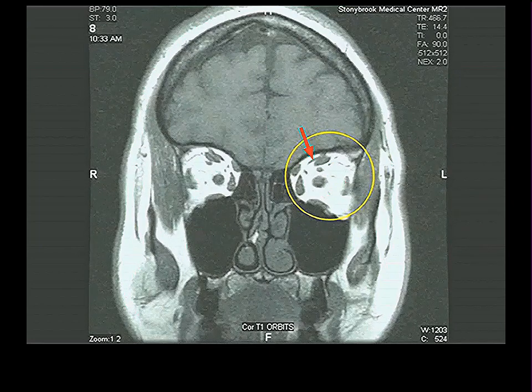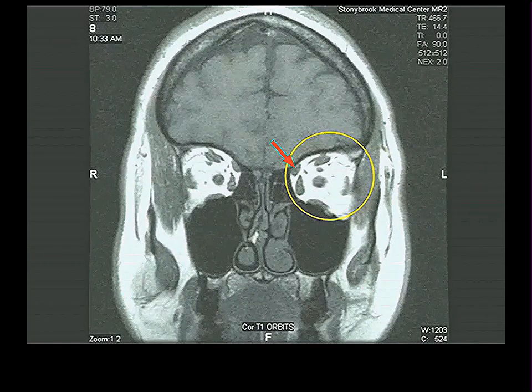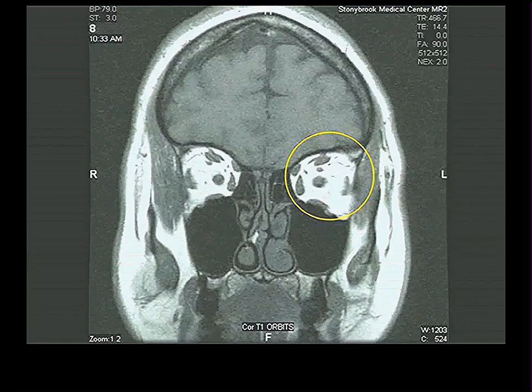And you see this little thin muscle. Yeah. Levator palpebrae superioris. On the right side, again, superior rectus, levator palpebrae superioris, medial rectus, inferior rectus, lateral rectus, and then this one other muscle. And that's the superior oblique. Very good.